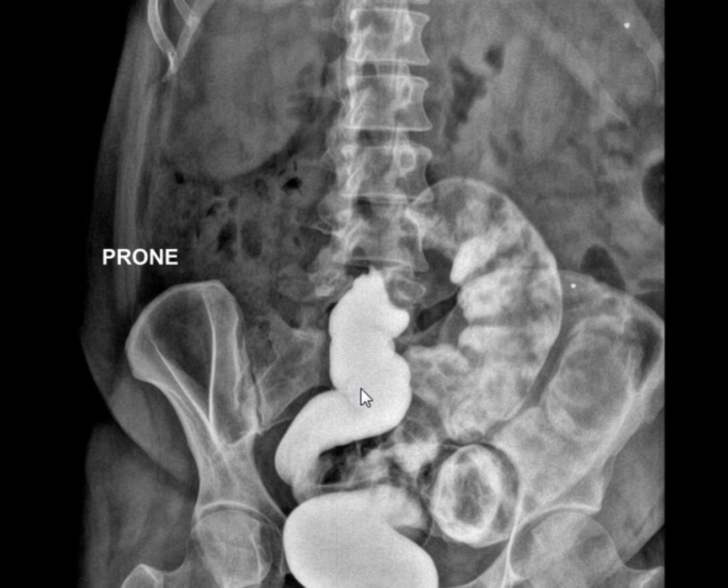Helminthoma. What's helmin? Parasite. It's like some sort of collection of worms. Post radiation. You must have a history of radiotherapy or it becomes fibrosis. But usually it's a long segment radiation.